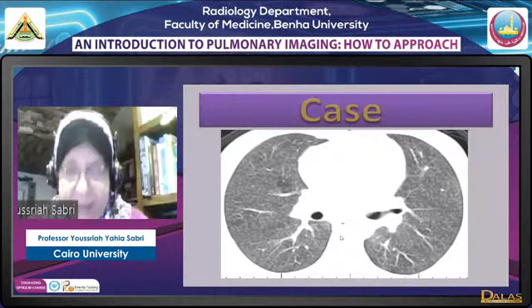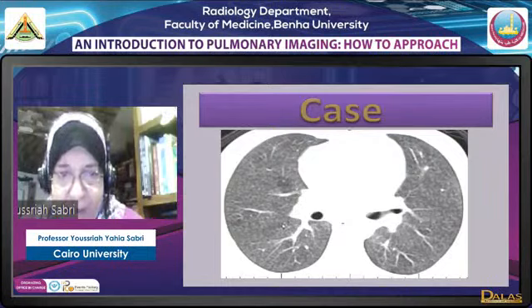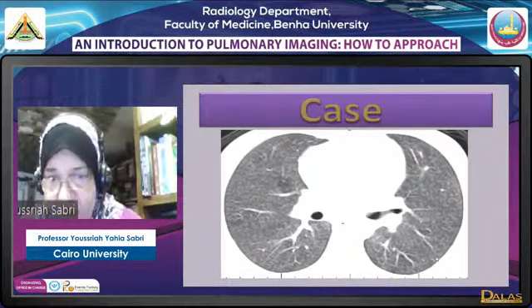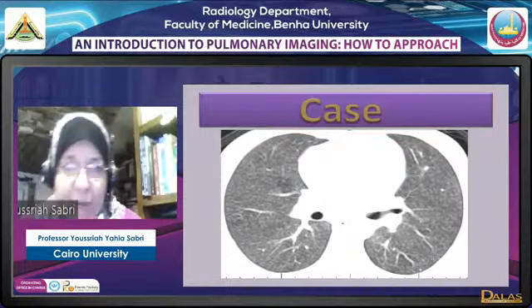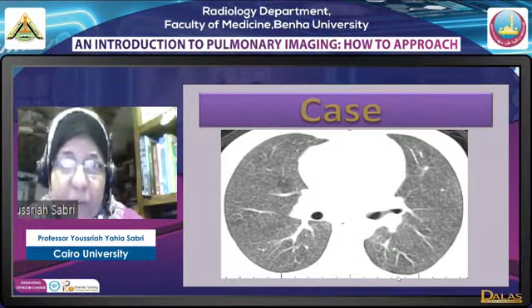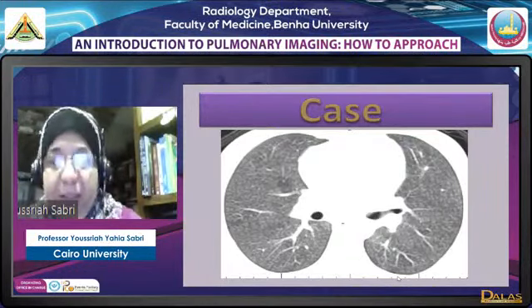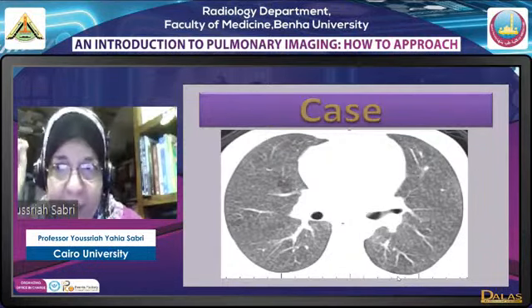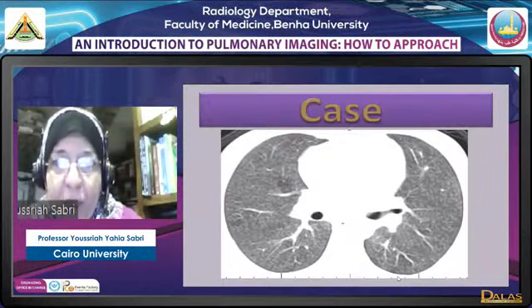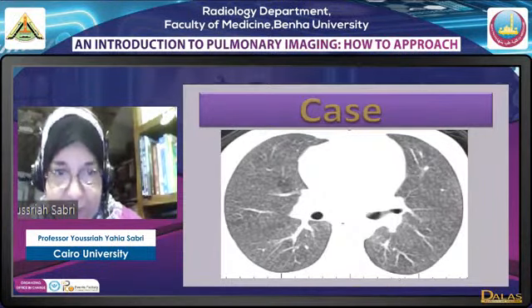In centrilobular nodules that are numerous like this, you can see the fissure as a hyperlucency; you can hardly discriminate the fissure. And these numerous centrilobular nodules that you will see filling the whole lung, with relative basal sparing, are specific for one of the appearances of subacute hypersensitivity pneumonitis.